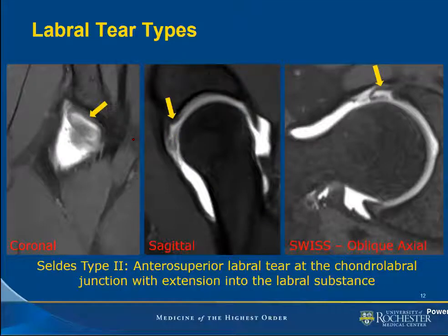Now, I wanted to emphasize on this slide the orientation of these labral tears in the coronal plane. The labrum and the acetabulum take on this diagonal morphology, such that the labral tear is oriented like this in the coronal plane. And this will emphasize the planes which are best at capturing this labral tear. On our sagittal plane, we're catching this labral tear probably at like a 60-degree angle, and we're going to nicely demonstrate the labral tear on the sagittal plane.